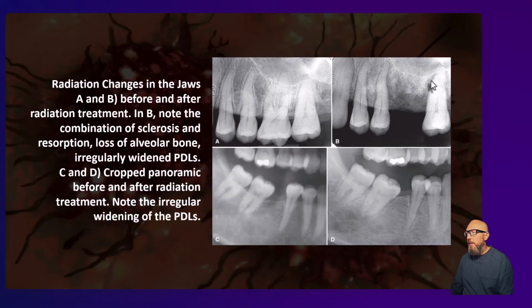Same with over here, lucency following the roots of the teeth like that. That's kind of classic for osteosarcoma, but it could be an inflammatory thing, right? And so you're thinking maybe osteomyelitis. Knowing the history of radiation treatment, then yeah, probably just radiation changes to the jaw, but that's going to have to be monitored really closely, especially if the previous tumor was a bone lesion, there might be recurrence there.